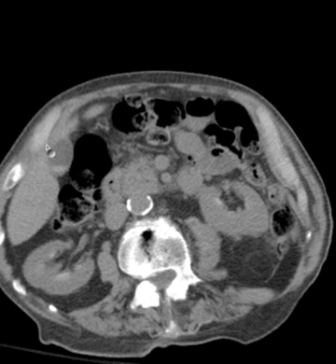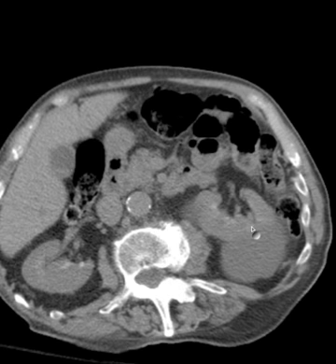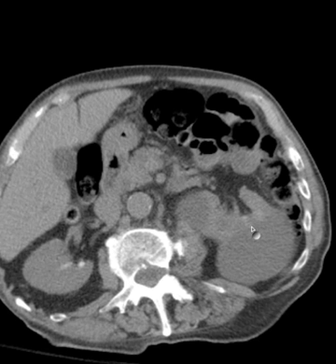Okay, and a bunch of cysts and some high attenuation material here in the gallbladder. Now that could be stones or sludge, or it may be that the patient had an IV contrast injection recently, because even though that's primarily excreted by the kidneys, a small amount is often excreted by the liver into the biliary tract.